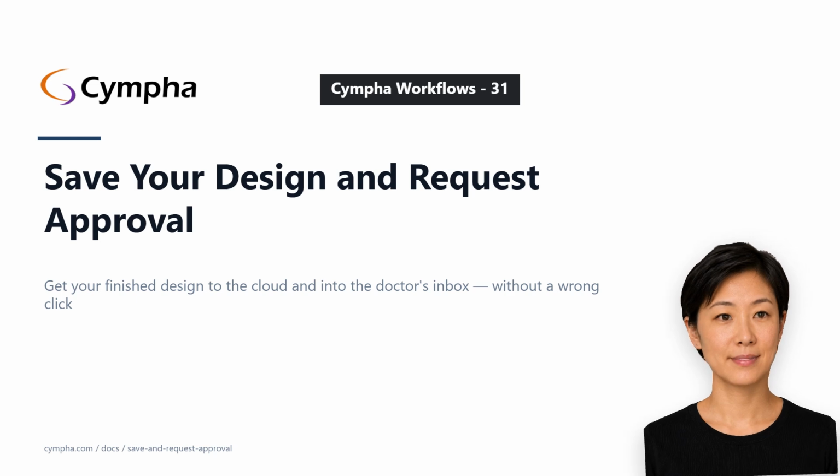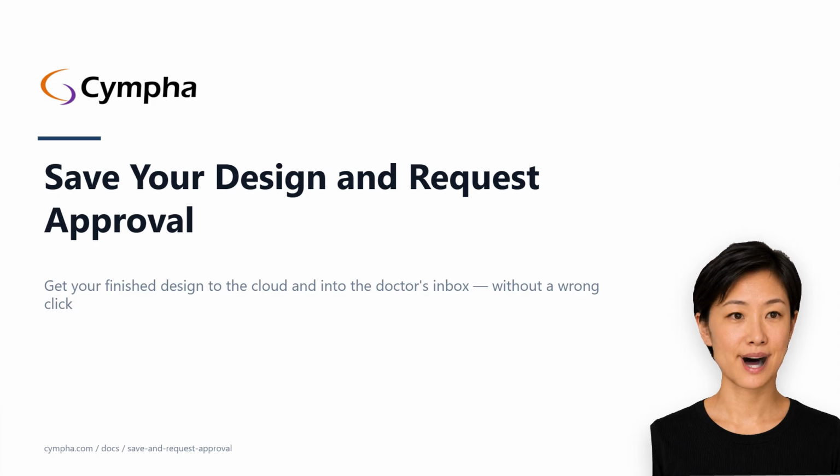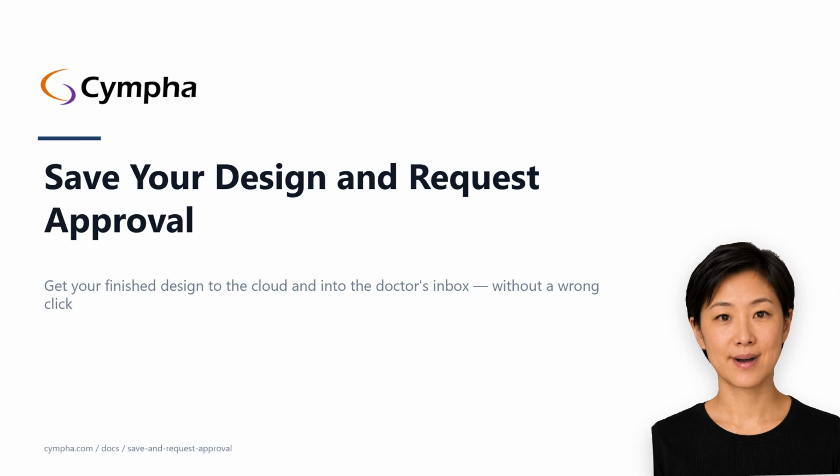Welcome to Guide Mia. Today we're going to talk about saving your design and requesting approval. This is the moment a finished design leaves your workstation and lands in the doctor's inbox for sign-off, a short workflow, but full of small rules worth knowing cold.